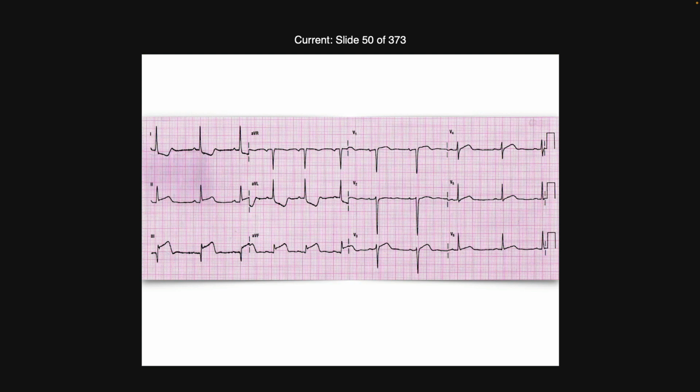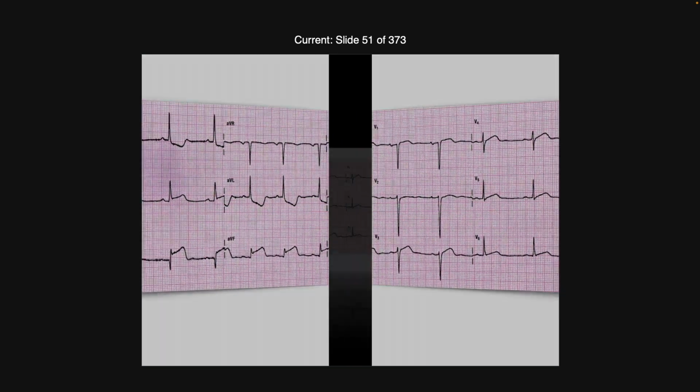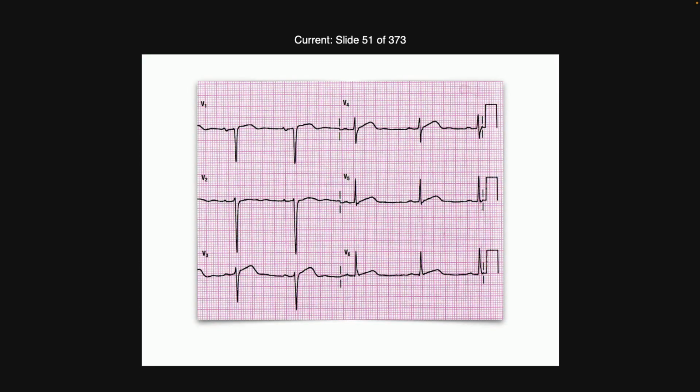Looks like the ST segment is starting to slope. Okay, so let's look. So we've got, no question here, STEMI alert, right? I mean, no problem there. But let's look at the V leads again.